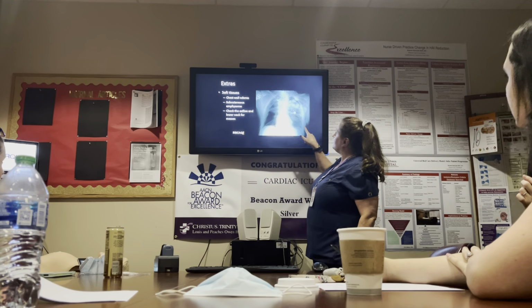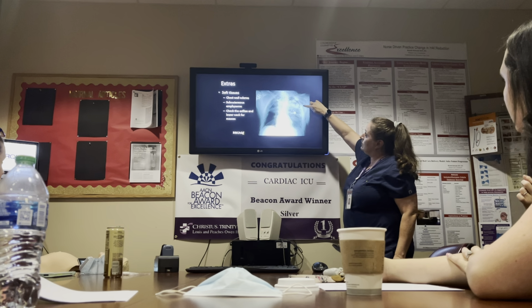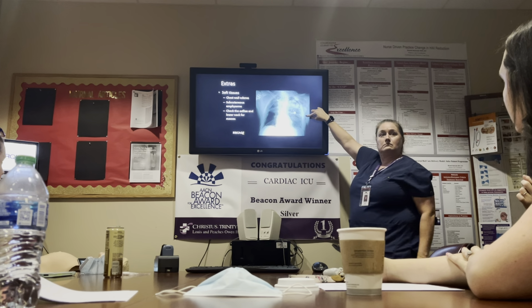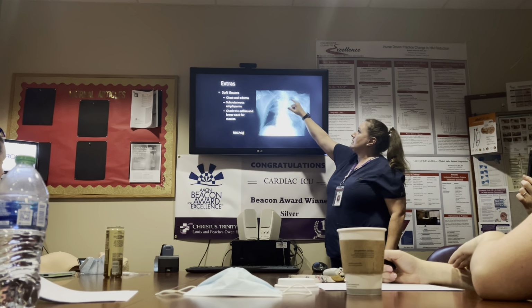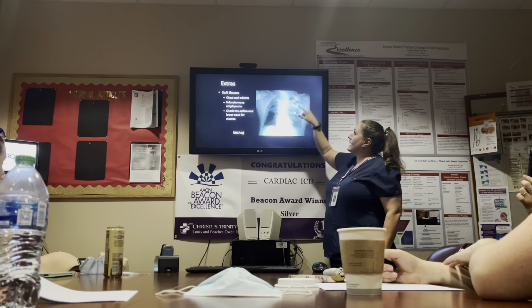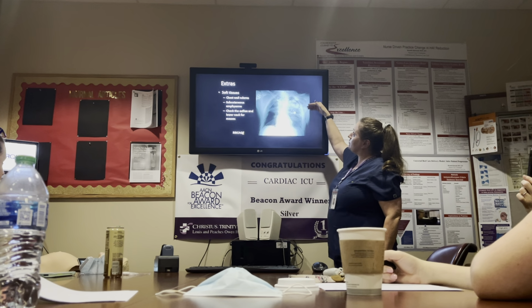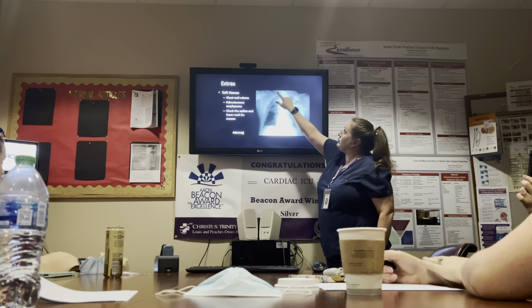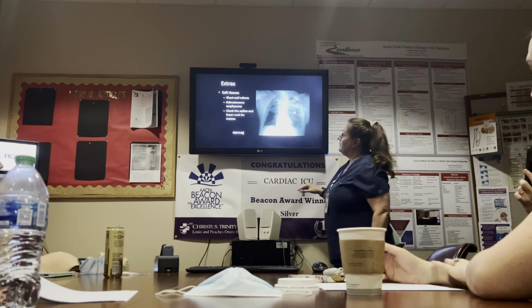You also want to look outside the area. So here is sub-Q emphysema, okay? You know this guy has it because of the chest tubes also, and we also know that there's a pneumothorax here, but there's air outside. And there's a little bit of air in this pectoral muscle, and you need to look up here because sometimes you can see air in the neck as well, okay?